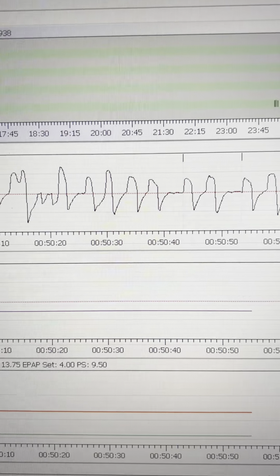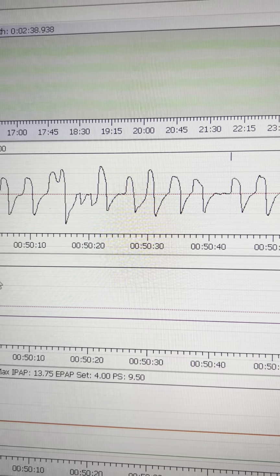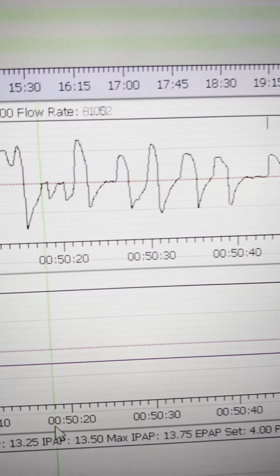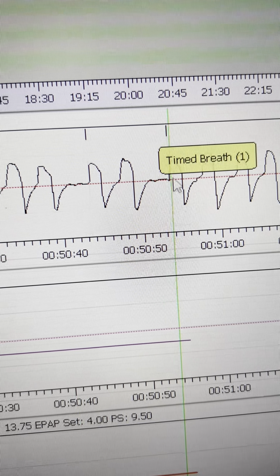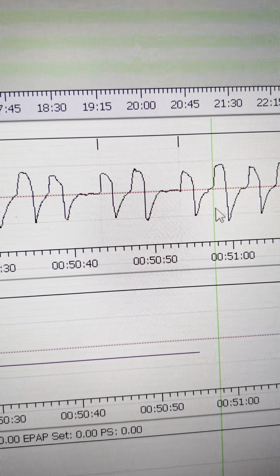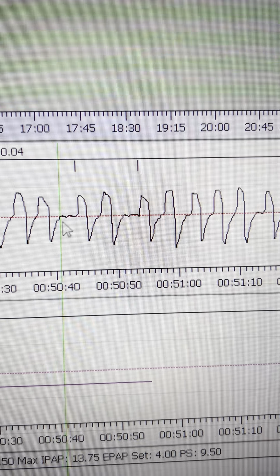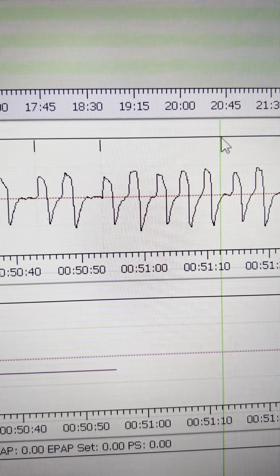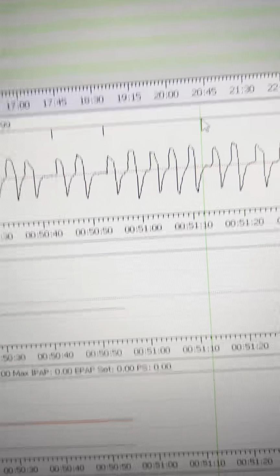Probably gonna do EPAP titration now from now on, so that's basically what you should focus on then. If, for example, you would be having a ton of, let's say not right here but right here more, like you can see here my breathing is trying to stabilize more, or there's still obstruction, I can't really tell. But imagine if here you're constantly seeing centrals happen afterwards, then you might want to up CO2 and they're not obstructions then.